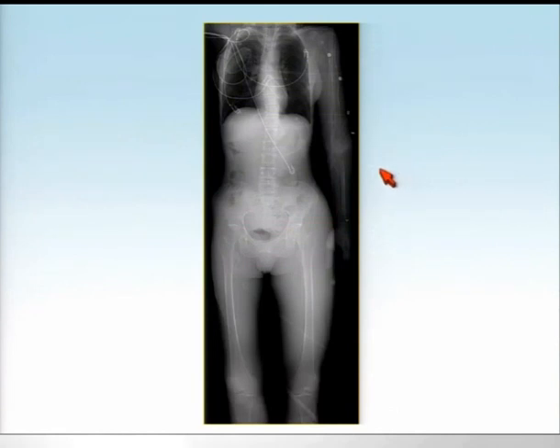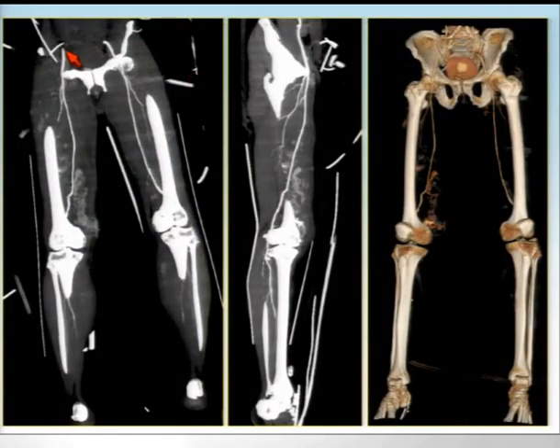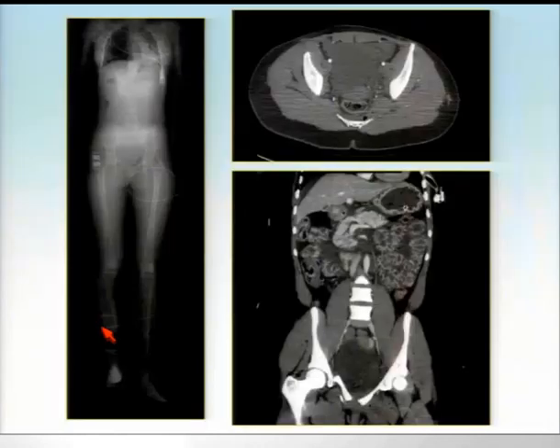Some examples of patients with integrated extremity angiography and torso imaging, whole body scout topogram, and you can see the extremity CTA in this patient that suffered really significant blunt soft tissue trauma. And you can see just really active leak of contrast throughout much of this patient's soft tissues. In this case, a fatal injury, very difficult to treat.